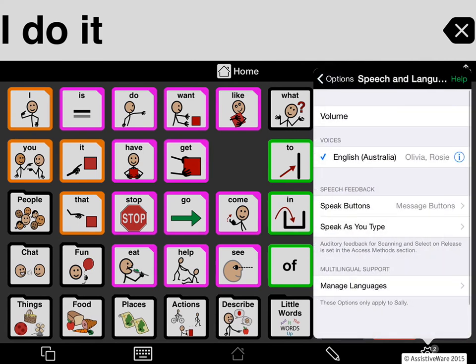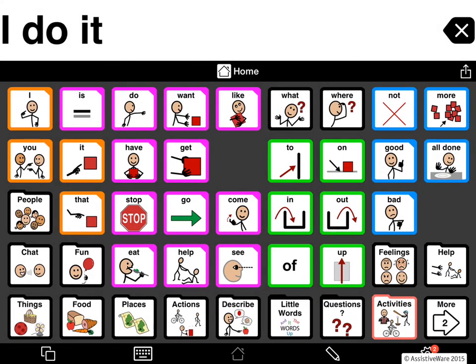Okay, so I'll come back here, and now I can touch a finger on the screen. Come, in, out, on, what, do, it, peep, chat, come, in. And when I lift up, in is selected. Another thing that's interesting to note is this is called first finger down. And this method will also ignore other fingers that are touched on the screen after I press that first finger.